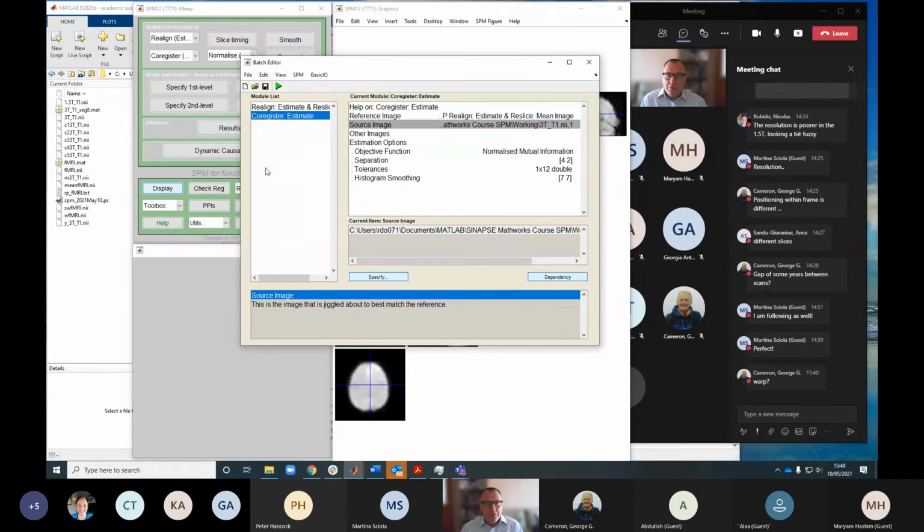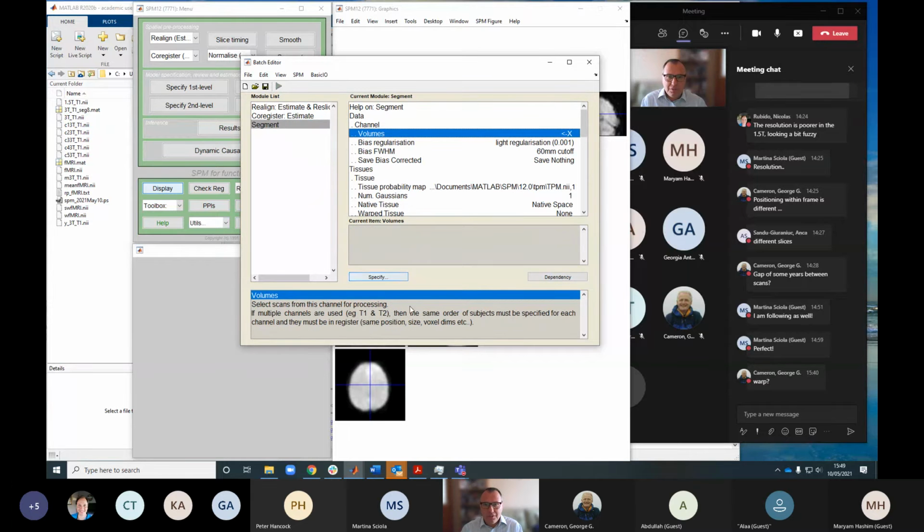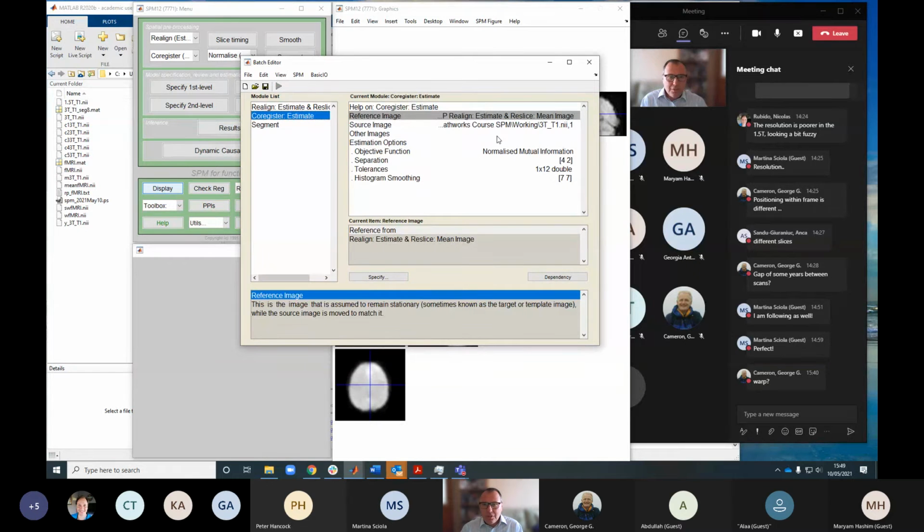But if we've got those two in the list, then we can go on to the next step, which was segment. It's going to ask us for a volume. Remember, up here, we're going to be changing the T1 because we're co-registering it.